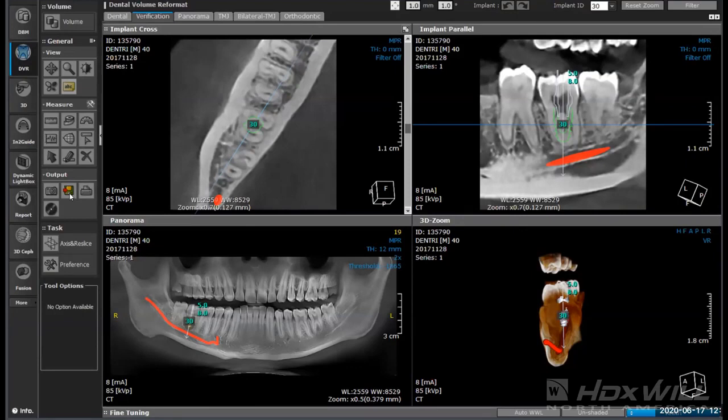So now this type of information is also something that if you're using a lab, you can send the DICOMs and an STL of the case that you're doing, and they can also see how you've planned it, the size of implant that's in there by looking at the project. That is also going to give them information to where they will extract their own DICOMs from this, but in the sense that they already see what you've planned and can walk through this. This also gives you the ability, again, in front of the patient, to go through all these steps to show where the implant's going to be and how it's going to be as well.